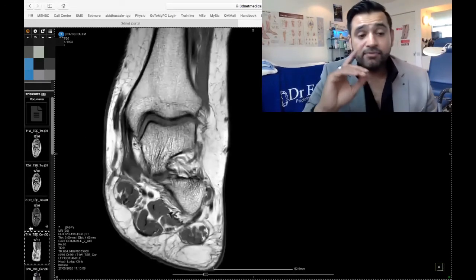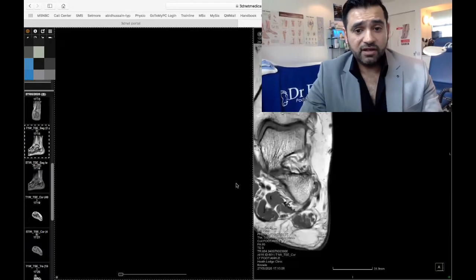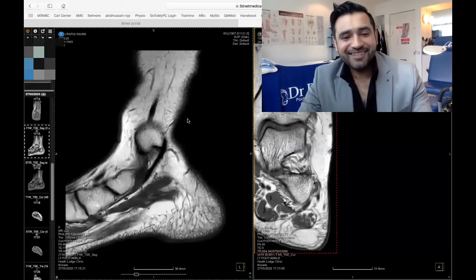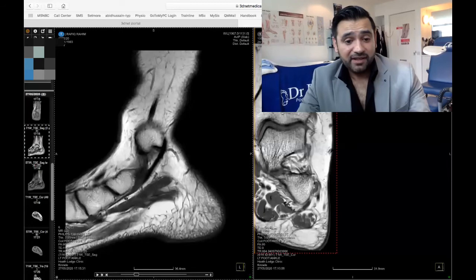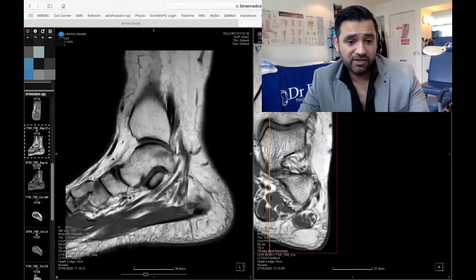I'm going to briefly go through the sagittal plane, which is brilliant to view. If I can get it up on screen, insert layer, insert here. Okay, so now this is brilliant. This is the tibialis posterior tendon attaching into the base of the navicular. That there is the deltoid ligament. And if I scroll further down, flexor digitorum longus, and you'll see bits of flexor hallucis longus, and you might even see the knot of Henry down there.